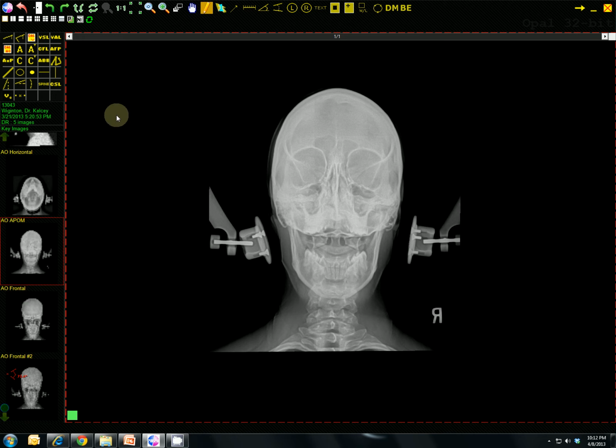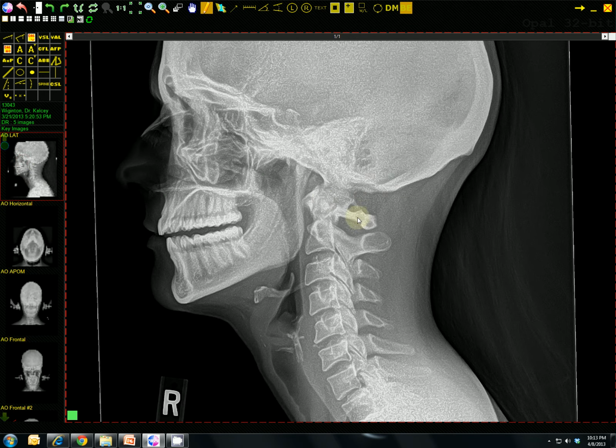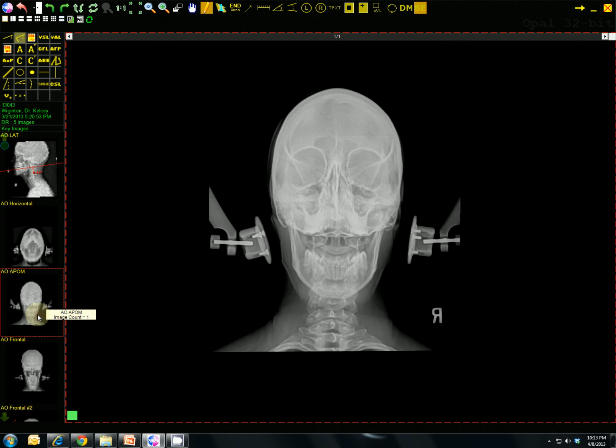Alright, today we're going to go ahead and go over the axial calculations. Very simple x-ray to actually analyze. Not complicated at all, just like the frontal, but very, very important to be able to do correctly. Obviously, in order to get this x-ray, we had to look at the sagittal x-ray, giving us the axial angle. Again, we'll just show that to you real quick. Going along this angle, it allows us to know exactly how to get this x-ray to come to this.